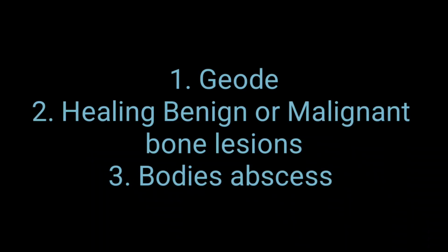Lucent bone lesions in the medullary cavity, well defined but having a marginal sclerosis without any expansion, indicate a slowly progressing lesion. The differential includes geode, especially subarticular cyst. Other signs may be arthritis.